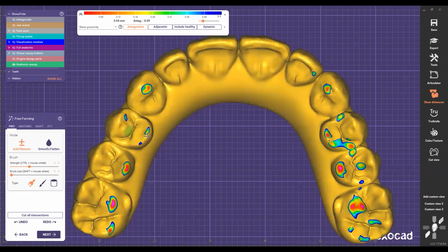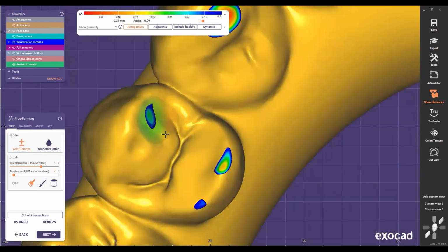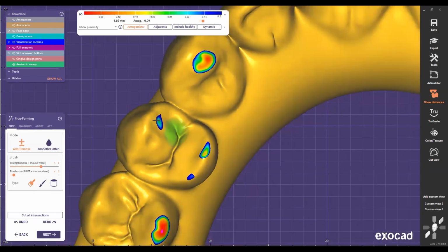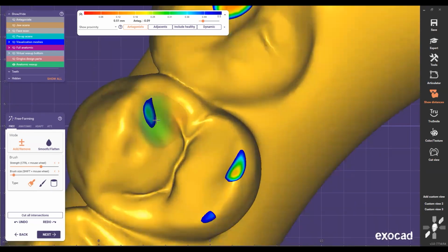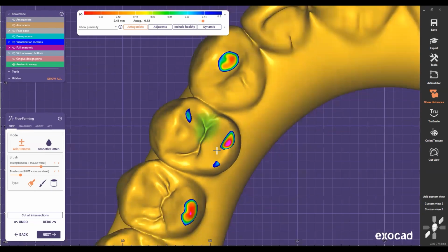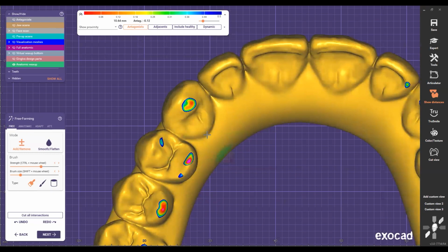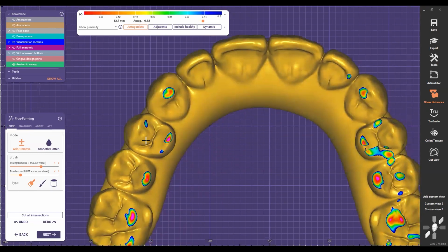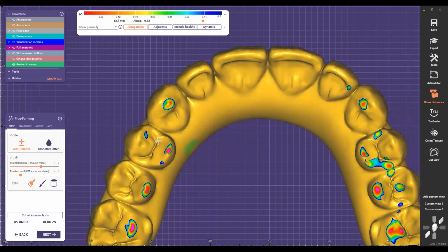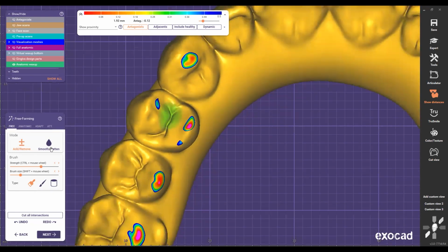This is my handpiece, right? In the room, I put the articulating paper, tap, tap, tap, and I'm like, okay, I see this occlusion. It's important for you to understand occlusion, because that way you can understand these colors, okay? If that's not the case, you can ask dentists that understand occlusion, they can educate you. For me, I learned this from Dr. Mireles, who is a course instructor. And also with this video, you will have an idea what to do as well.